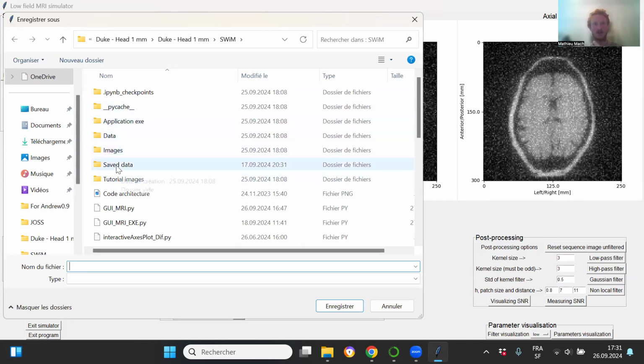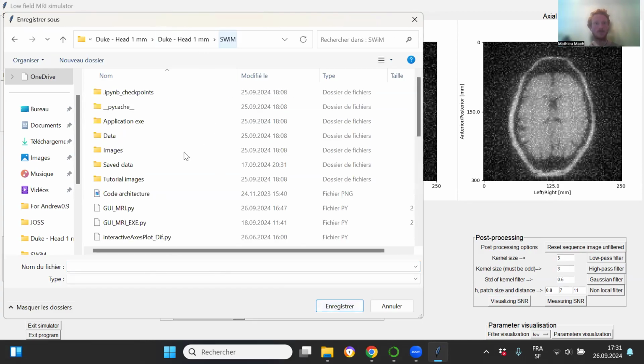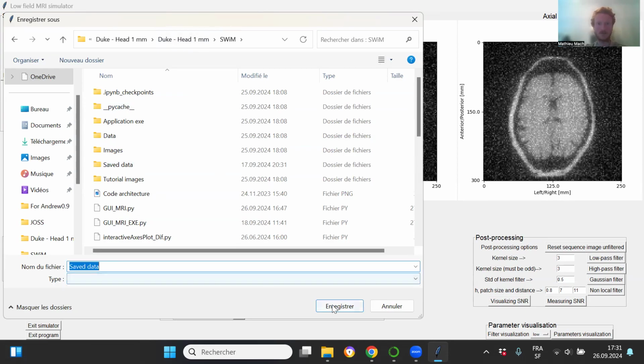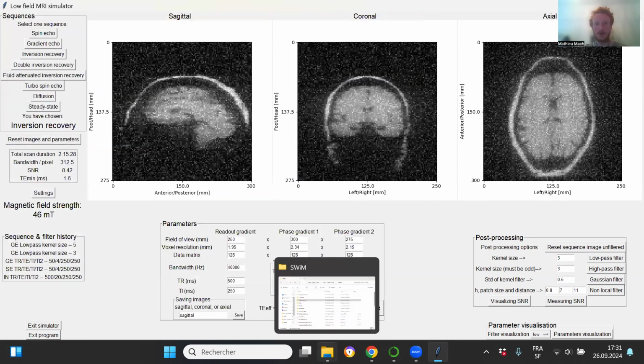So I just created an empty folder here. And if we just, for example, like that. There we go.